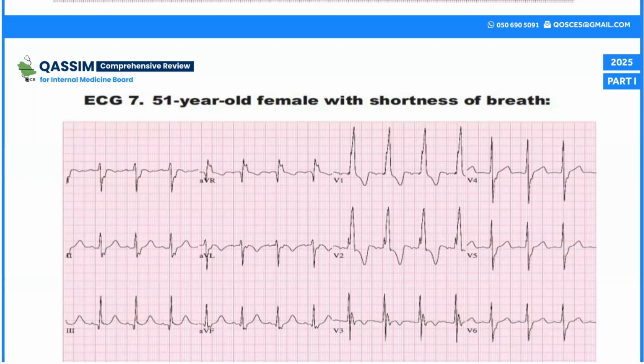So this patient does have right bundle branch morphology, and in the setting of a sinus tachycardia, actually not sinus tachycardia, with an underlying sinus rhythm. So what could explain the shortness of breath? Again, we forgot to say this, with right axis deviation, with right bundle branch block morphology, and with fascicular block. So she does have bifascicular block with sinus rhythm, right bundle branch and a fascicular block.